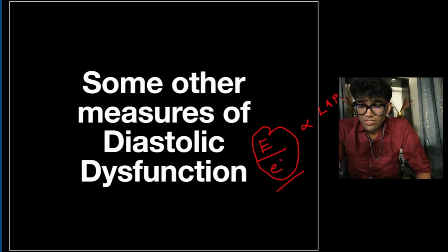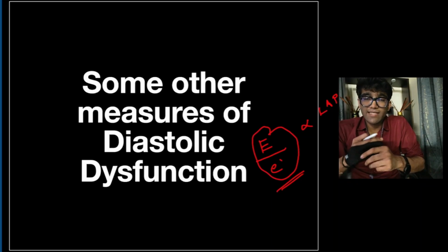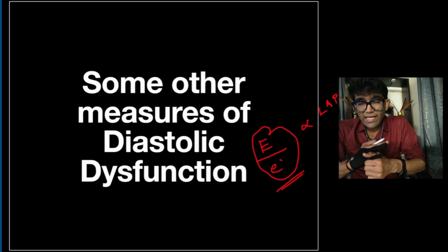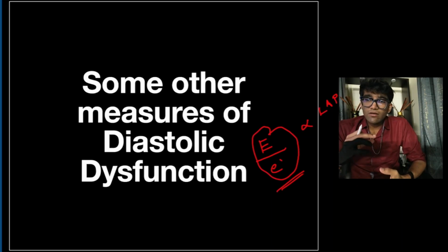We use this relationship to quantify left atrial pressure. We say that it is elevated or not based on this, and it is directly proportional. So if it is elevated, you definitely need to consider that the patient has an increase in left atrial pressure.